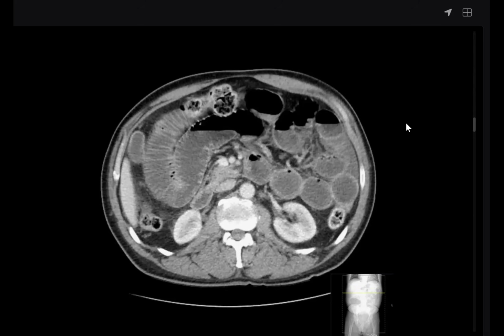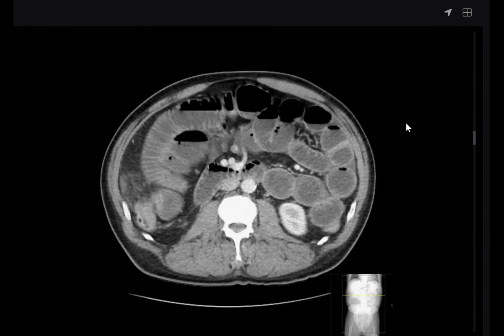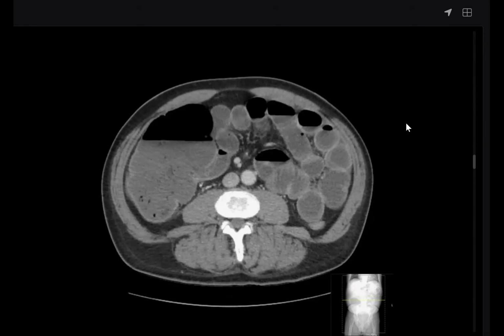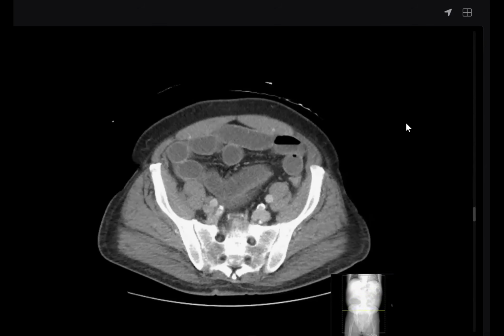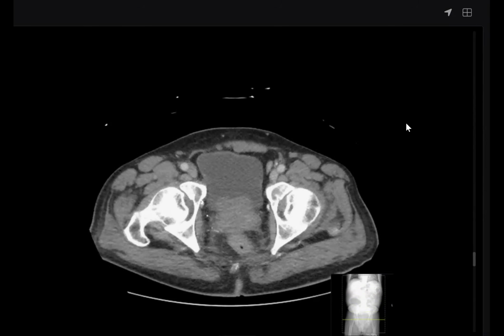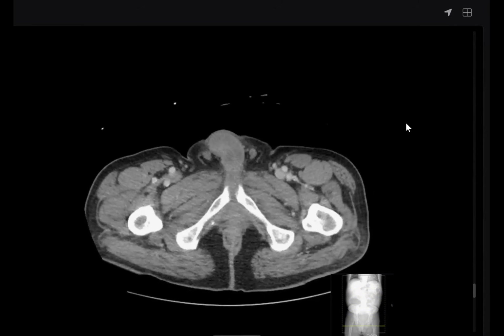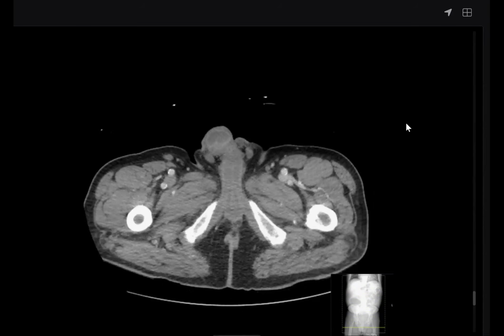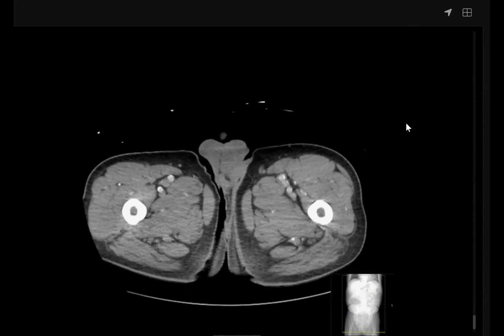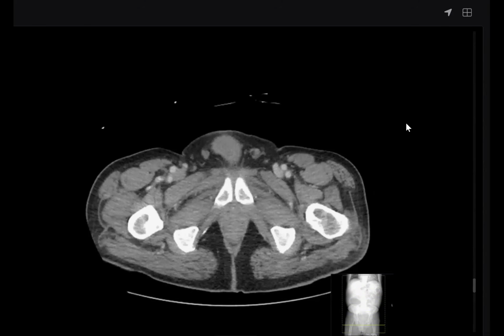There are multiple dilated bowel loops appreciated in the abdomen. I would like to scroll to the last cut, and then I will give my findings. I cannot find any inguinal hernia, obturator hernia, or femoral hernia in these abdominal wall images, or any anterior abdominal wall hernias.